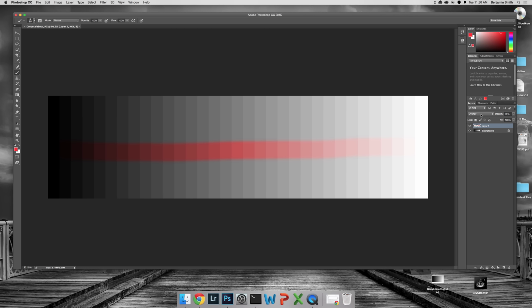The two that are really useful for what we're doing here, though, are Darker Color and Lighter Color. Let me select Darker Color and show you what I'm talking about. You immediately see that this swath of red is now not colorizing the left side, the darker grayscale gradations. It's only coloring the lighter gradations. So now it's actually useful. We're starting to be able to selectively color something in the ultrasound image. And let's just say that we wanted to colorize just these over here.